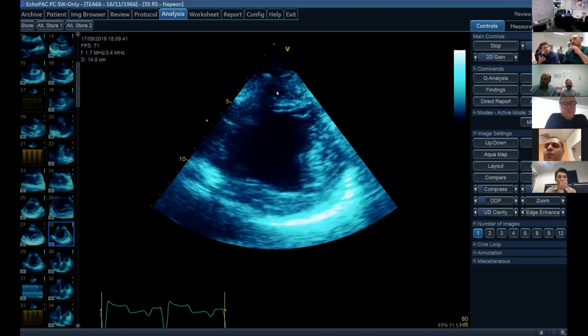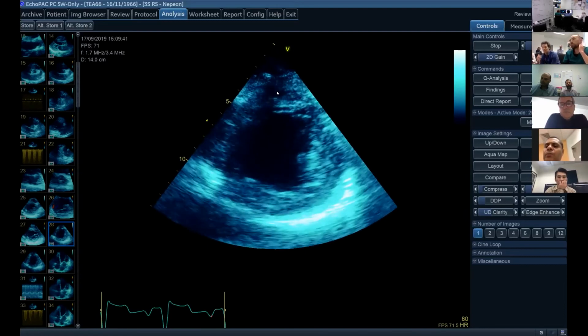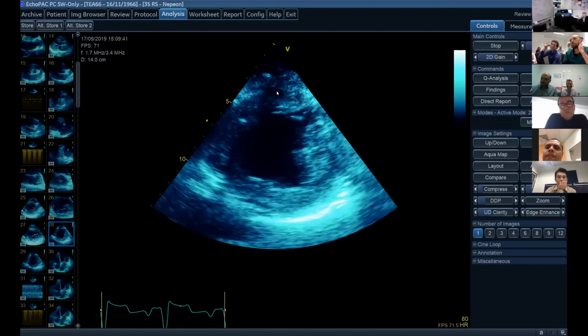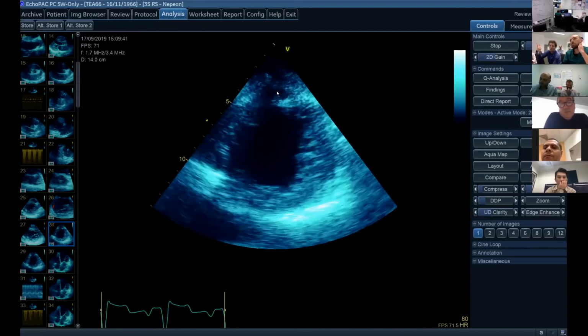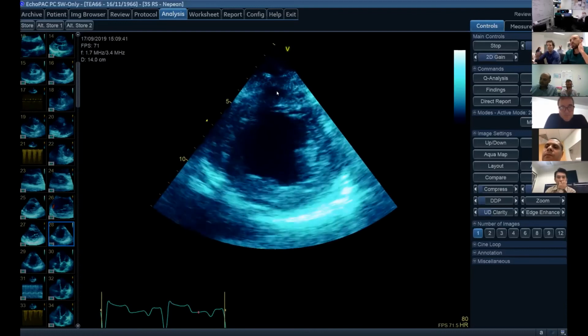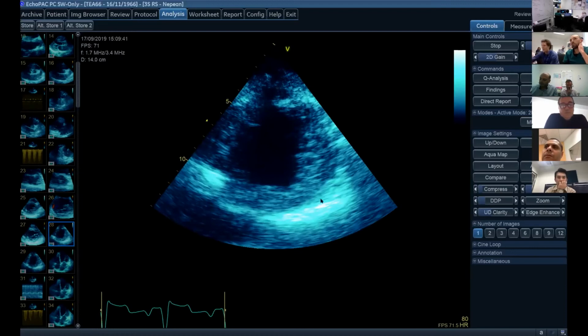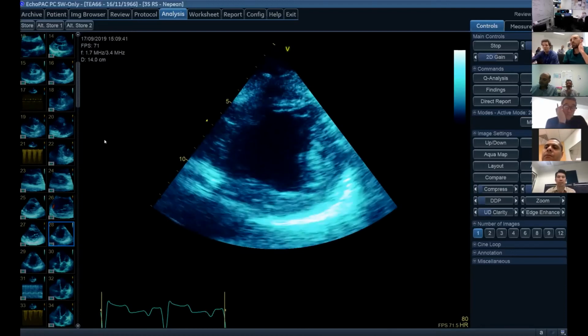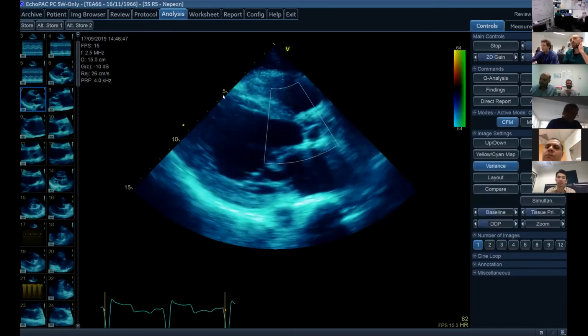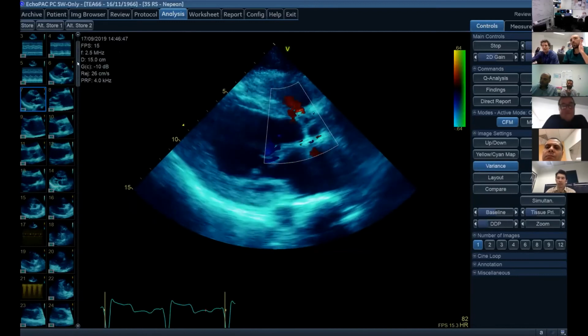And my last rule, just to finish things up, is that after we've talked about the segments, chronicity and coronary artery territory, we want to back it up in two views. For regional wall, this short axis is my backup view. But for example, if you said you thought the anteroseptal wall was down, which view would we want to have a look at to back that up?